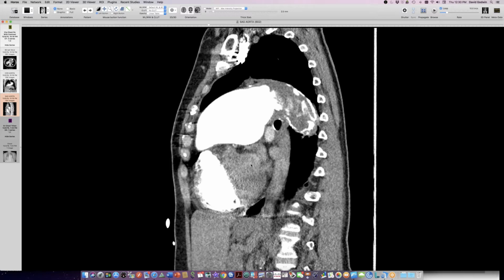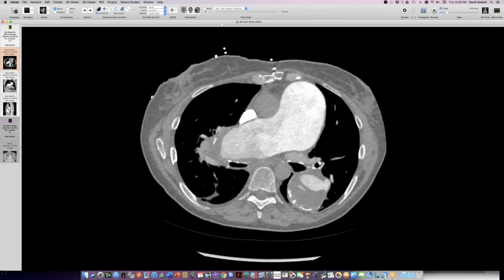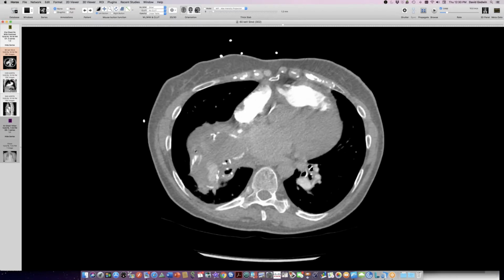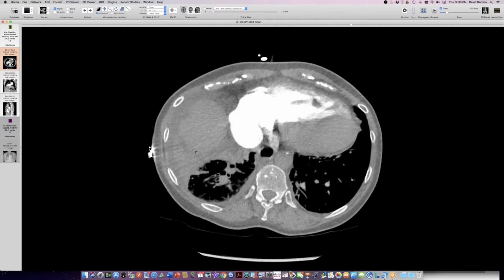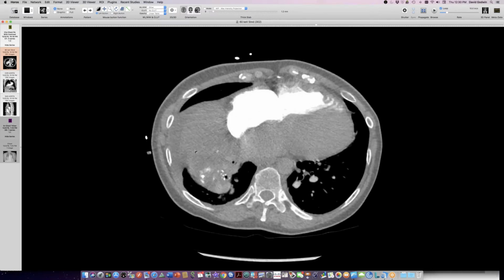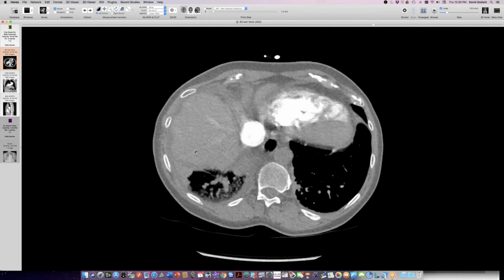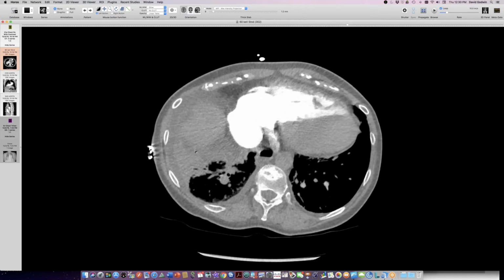Can you show some of the distal vessels? Are they open or are they occluded as well from this? I mean, that's really impressive mural thrombus. Yeah, wow. They're gone. They're gone on the right. It's a little early phase, but yeah, they look gone. I wonder, and the reason is that they say here that the endarterectomy doesn't really work on the in situ thrombus, that it just reclots it.